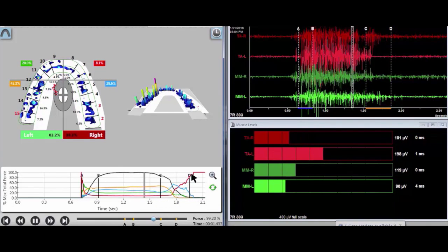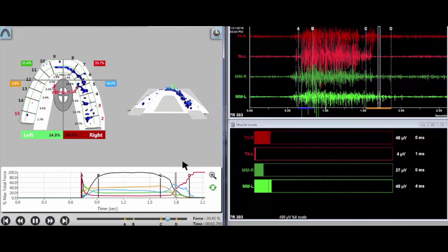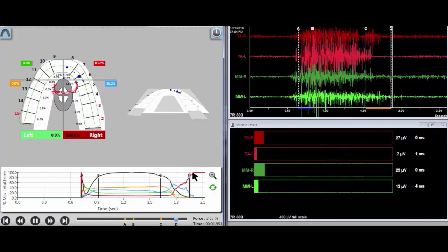In the graphical interface, notice the red line is moving up towards the top of the Y or force axis very quickly. The blue is no longer there holding it up due to no more working interferences in the posterior. Thus, the disclusion time is greatly reduced.